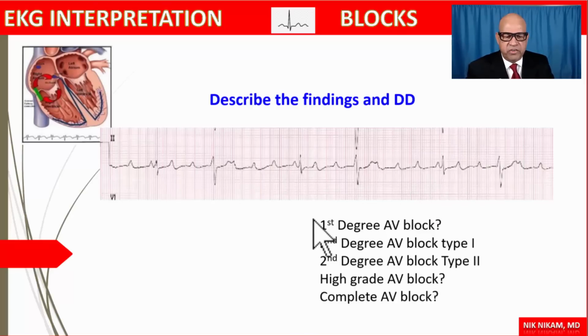So this is not a first degree AV block. This is not Wenckebach. This is not second degree type 2 AV block. And do we have a high grade AV block? Possibly, yes. Is this complete heart block? It doesn't look like complete heart block.